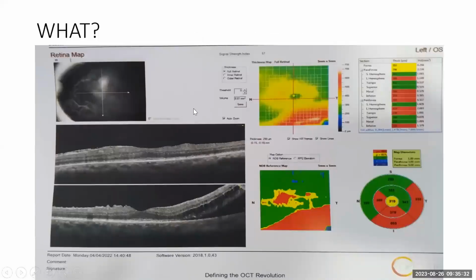In the lower picture you showed to the left, the retinal surface is corrugated. That's correct, yes. So it's not smooth as we should see. Then to the right, besides the separation of the neurosensory retina, there is also fine hyporeflectivity. Now I'm not sure if it's fluid accumulation or if it's the macula, maybe retinal schisis that you just explained, but that's what I can see, sir. Okay, thank you.